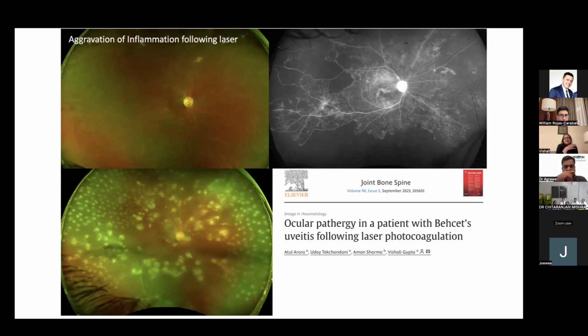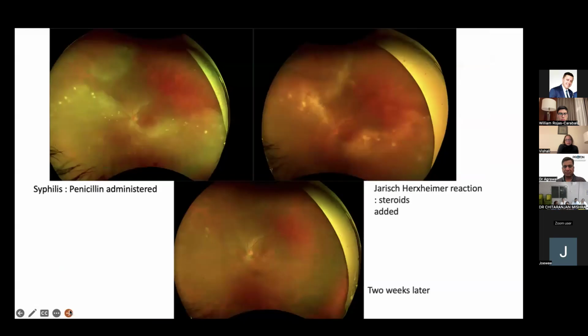And in the fluorescein, capillary non-perfusion was so overwhelming to me. I thought, okay, let's laser it. But probably if you see these patches, even in the periphery, it's better not to intervene at that point till the time you have inflammation totally under control.